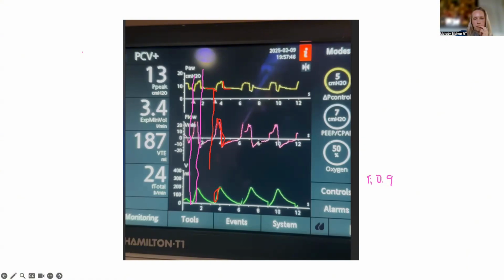And if you've been following along with my craziness, you know that's a mainstay in our discussions: is there auto peep? And I think, is the area under the curve different? I don't know if it's different. It looks almost similar. Maybe you can talk me into it being a little bit different, right? The area under this curve and the area under this curve is about the same, maybe a little bit less. It certainly doesn't get to the baseline there.